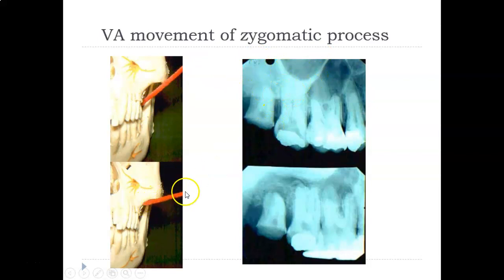This image is flattened out more. So now it's a little bit more perpendicular. So essentially the beam was raised up, right? It went from being angled sharply down to raising the beam up slightly to be more level. And look how much the zygomatic process lifted up out of the image. So it went from way down here to way up at the top.